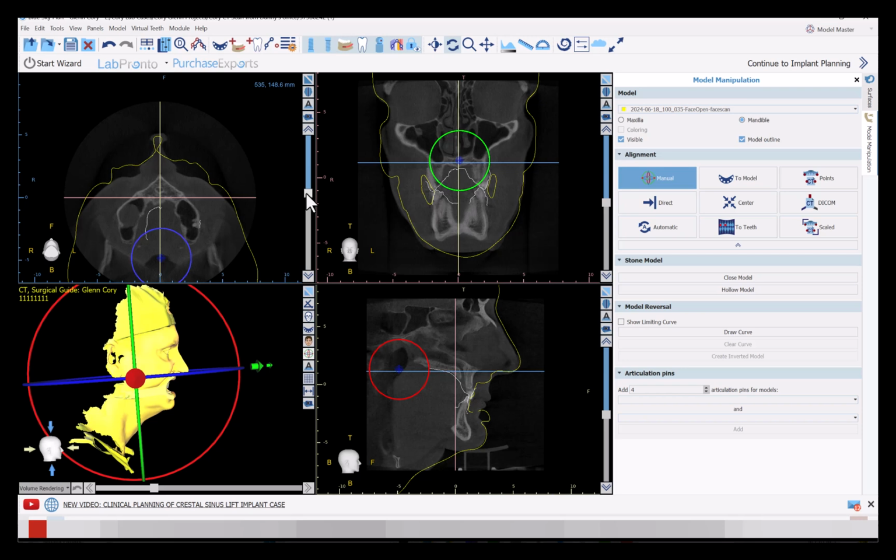I don't like it. It's not accurate enough. And so the point in saying all this is if you have a Metismile, then do yourself a favor. In my opinion, the number one advantage to that particular facial scanner is that awesome stitching software that brings it all together, whether you're using their intraoral scanner or not. It will bring it all together natively within their software. It does it accurately. You can verify it due to that larger scale color map.